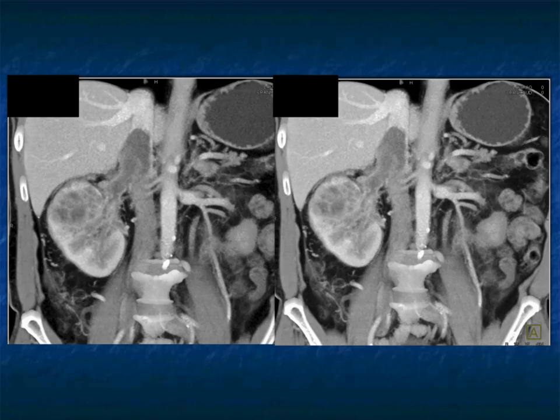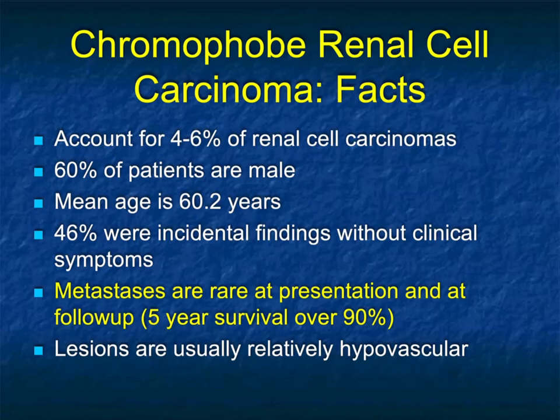And here, just as we go toward later venous, very nicely showing you the extent of renal vein involvement, IVC involvement, but not all the way up to the top of the IVC and into the atrium. So again, a very nice example. Patient will get a nephrectomy. The surgeon will go and remove tumor that extends into the IVC, but won't have to do a transthoracic approach as well. Now, there are other tumors that tend to be forgotten about, but are important.